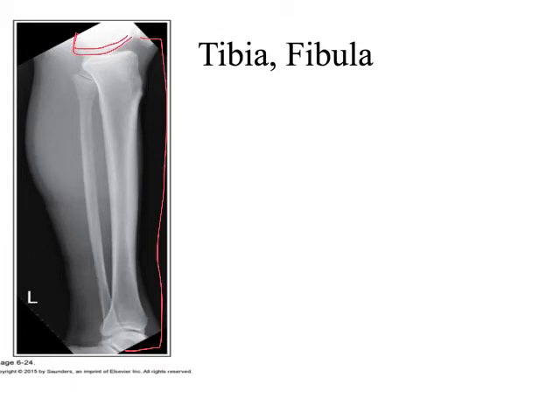It's helpful to see it because the fibula does bow out posteriorly a little bit, so it's going to be difficult to see them both superimposed, which is nice. We have the joint space open on either side, and yet they appear to be slightly separated, and that's going to be somewhat patient dependent too.